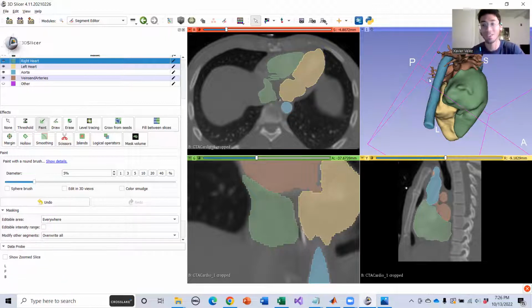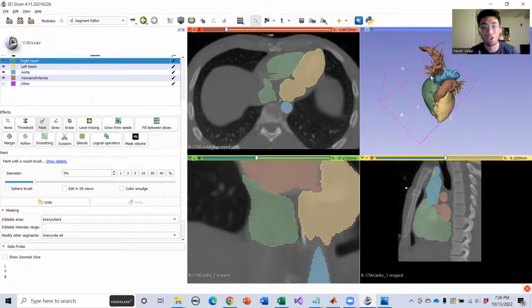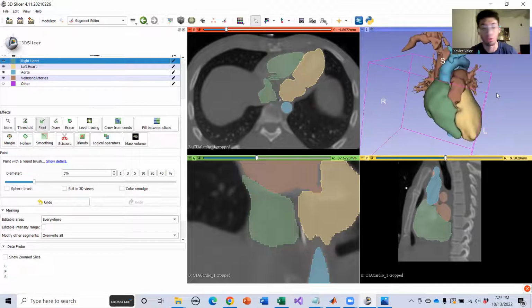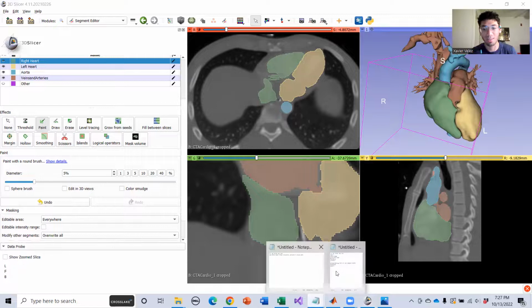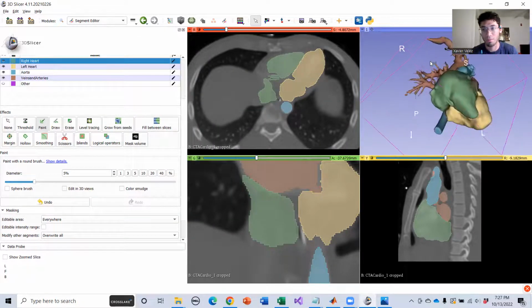Okay, you're right though. I need to end this workshop. So really, you'll just run a few more smoothing filters if you want or need to, and then that'll be it. I might skip the final smoothing step only because we haven't really done a lot of the manual editing steps, so they're still pretty smooth.